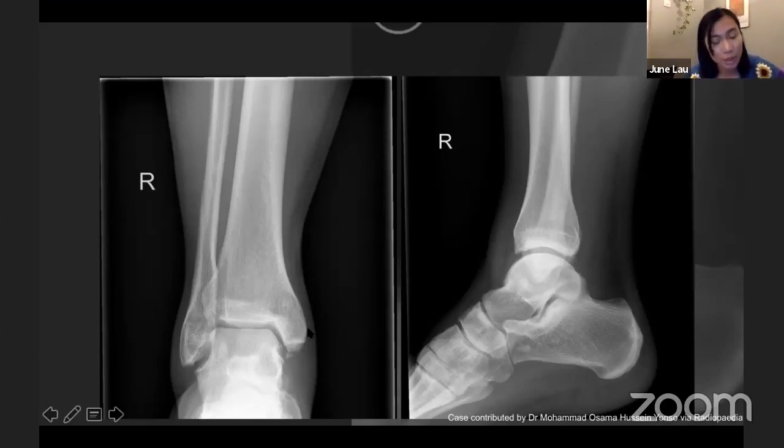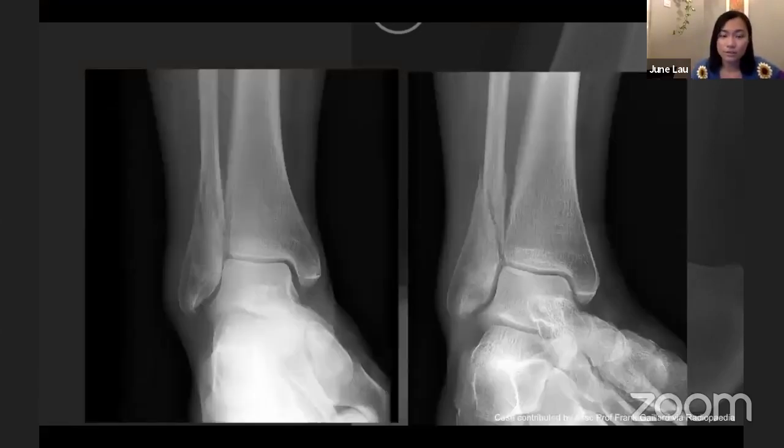Well, it'll probably come with a bit of history. There's a lot of soft tissue swelling in this region, and this doesn't look like a well rounded chronic piece of bone. Basically, it's angulated. You can see there's a fuzzy border from where it just came off, so it makes you think this is a fracture, and that's right.